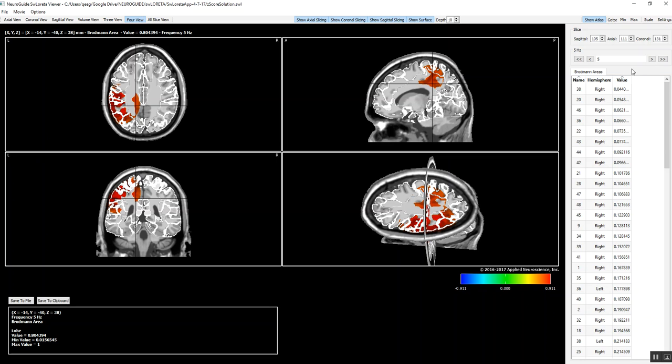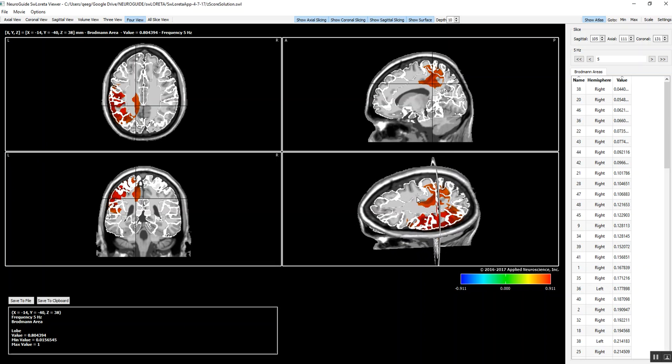We also will have a tab up here that says networks, in which you'll be able to select the anxiety network, the attention network, the default network, the memory networks, etc. And just click on them, and immediately you'll highlight the Brodmann areas that make up those networks, and you'll be able to explore those networks that are linked to the patient's symptoms. You'll be able to save the z-scores, order the z-scores, and put them into a protocol for neurofeedback as well.